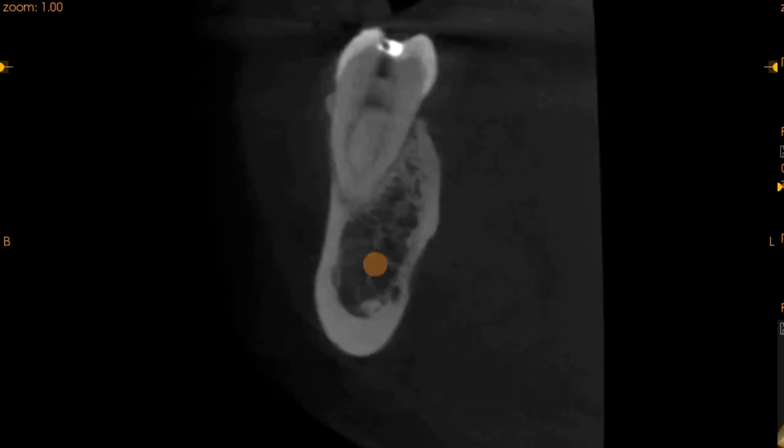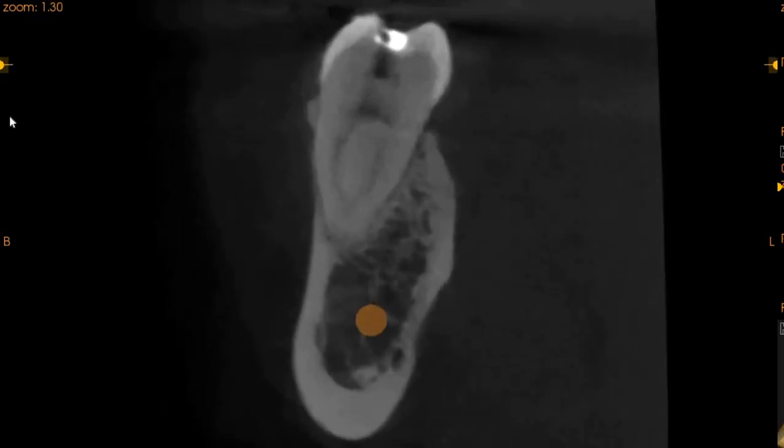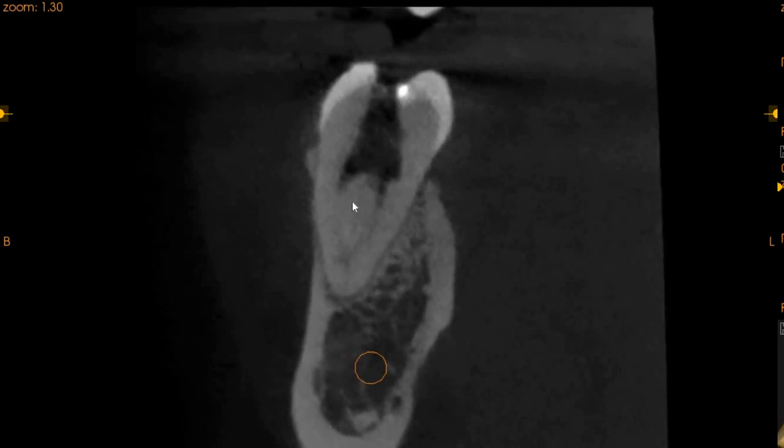On the transaxial aspect, here we can clearly see that we have two canals in the mesial root, the mesiobuccal and the mesiolingual, and both start separately but join to form one apex. This is 75 micrometers. We can see that they start separately and join at one apex. The chamber opening has been done and we can clearly see that it is still at the orifice level.